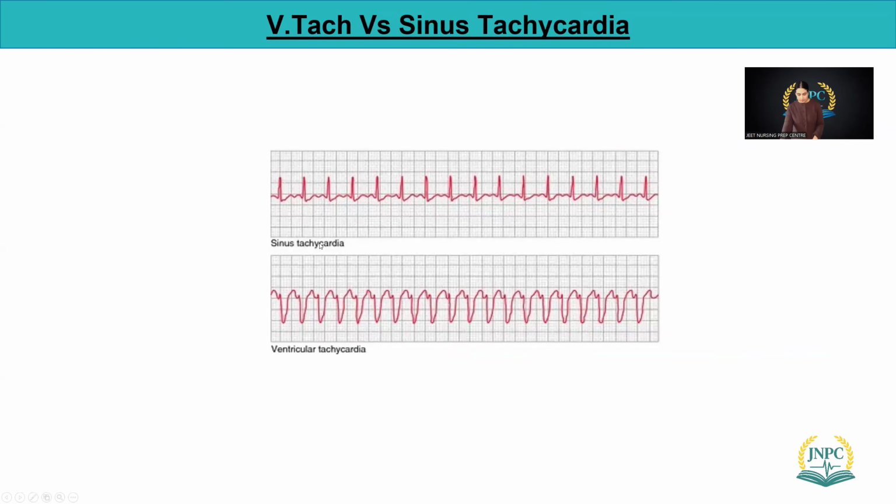Okay, so this is another one, sinus tachycardia. Look at that sinus tachycardia. Can we look at the P wave? Yes. QRS, yes. And then the T wave. And then again P wave, QRS. When you can really locate PQRST, now this is sinus. And moreover, the gap is equal.